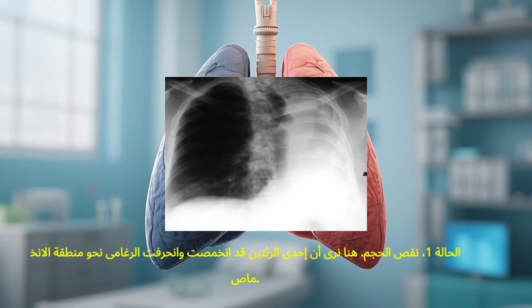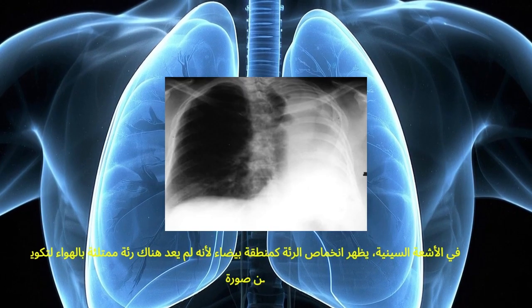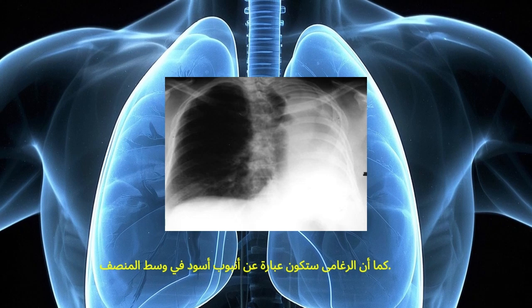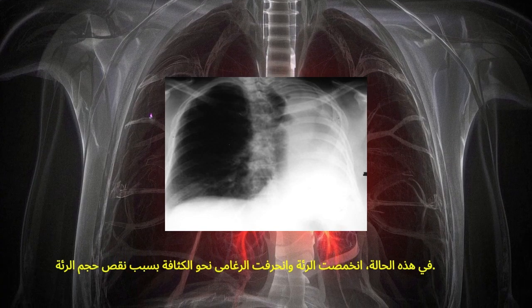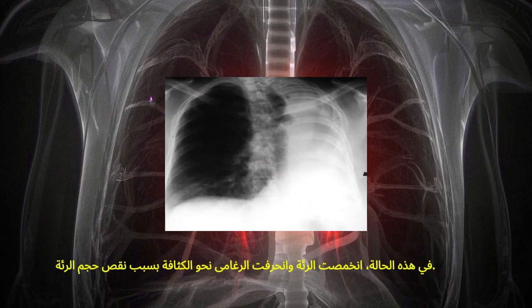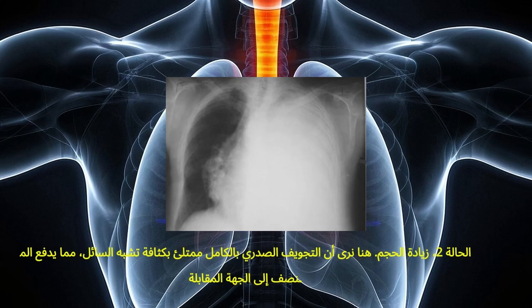Case 1. Reduced volume. Here we see one lung has collapsed and the trachea is shifted towards the area of the collapse. On X-ray, lung collapse appears as a white area because there is no longer an air-filled lung to create an image. The trachea, however, will always be a black tube area in the center of mediastinum. In this case, the lung has collapsed and the trachea has shifted towards the opacity due to decreased lung volume.